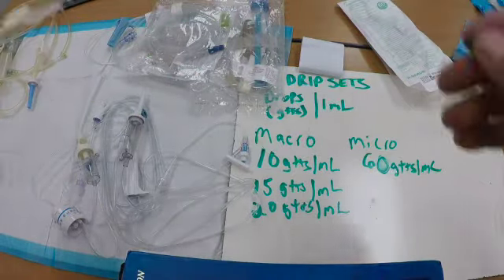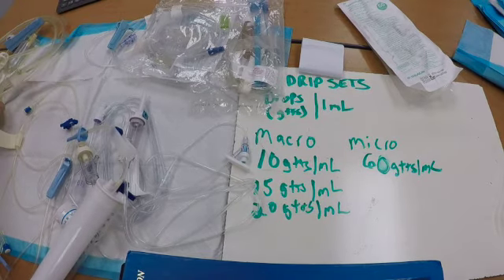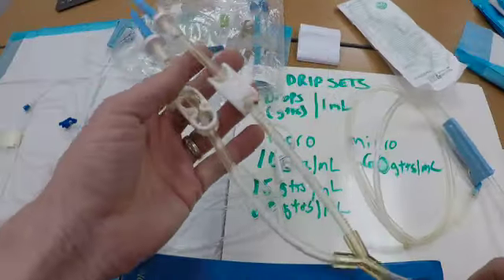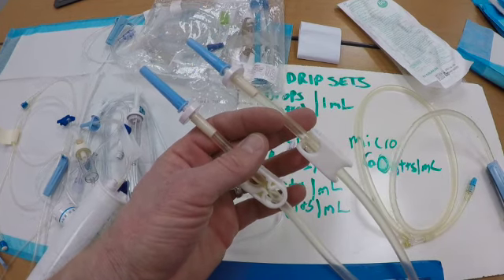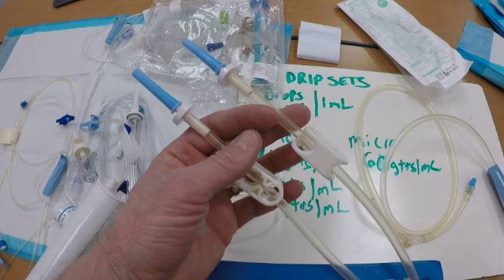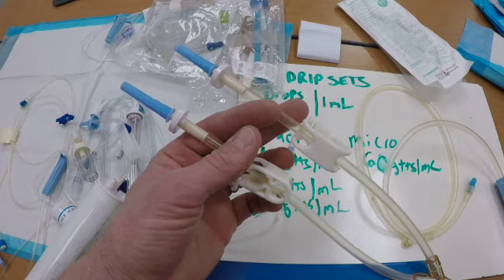And all of these can be substituted with IV pumps. And last but not least, this is trauma tubing or blood tubing. And this has two ports. One of them is going to go to, if we're going to give blood, it would have to be normal saline. You couldn't use lactated Ringer's in this case. If we're going to infuse blood in this, it would have to be saline.